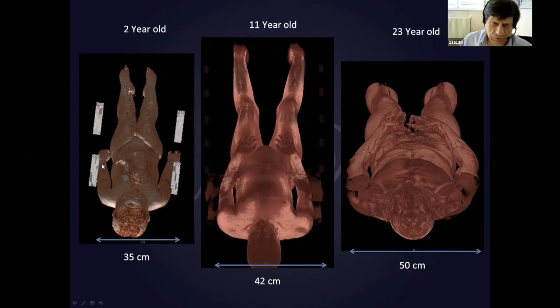It's important not to cut the upper limb because you have details in the upper limb, and it's important for pattern recognition. So the technician has to be aware to have a good placement of the upper limbs along the trunk or just in front of the trunk, but not to cut the upper limbs.